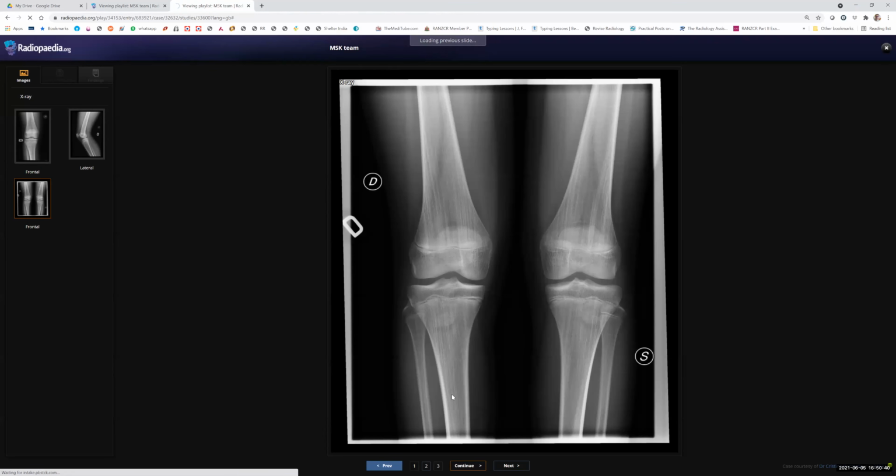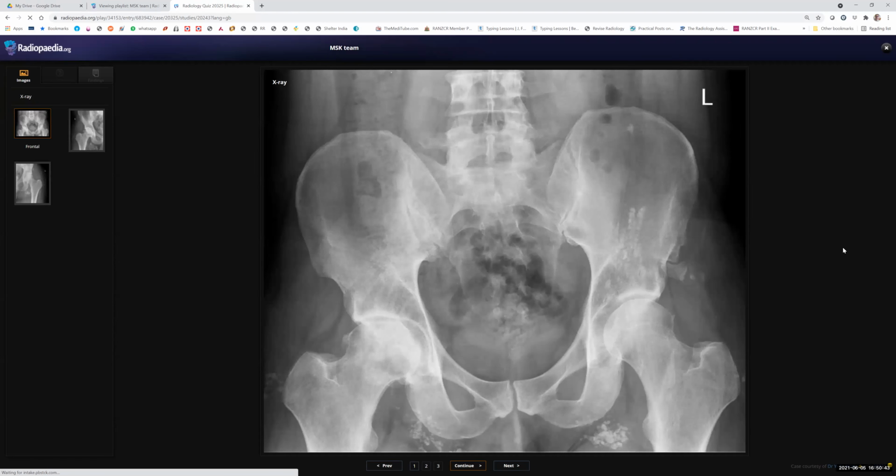Correct. Okay, then this one you correctly spotted. There is avascular necrosis of the right femoral head with steroid therapy. The patient is suffering from a chronic disease called dermatomyositis. So it's a story case: dermatomyositis and avascular necrosis. You have to assume that the patient is taking steroids, and that's why avascular necrosis came. It's a story. Okay.